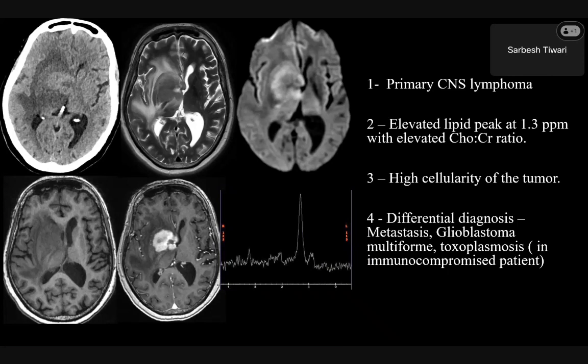Invasion of artery. All right, next, angiocentric lymphoma. Okay, then, so always remember, when you are talking about lymphoma, you can have large lesions. Okay, so let's move ahead then. Toxoplasma is a differential.